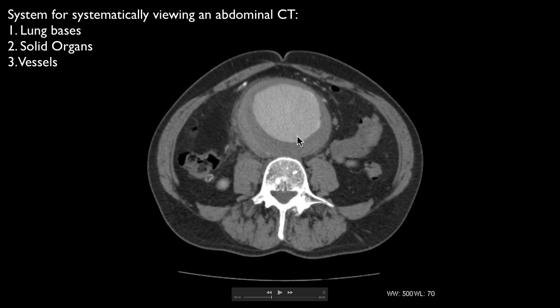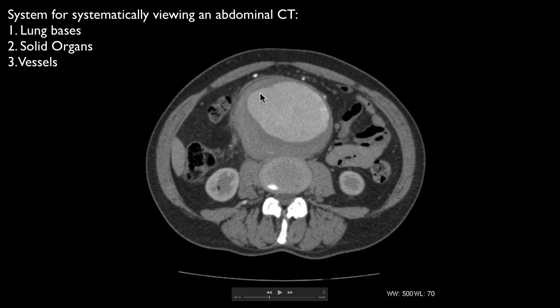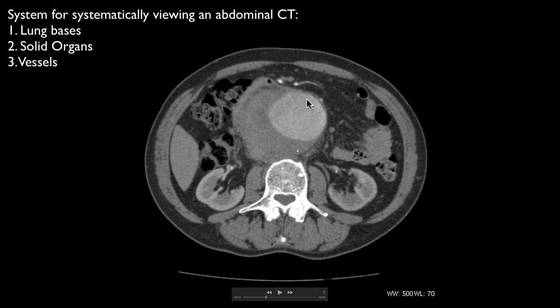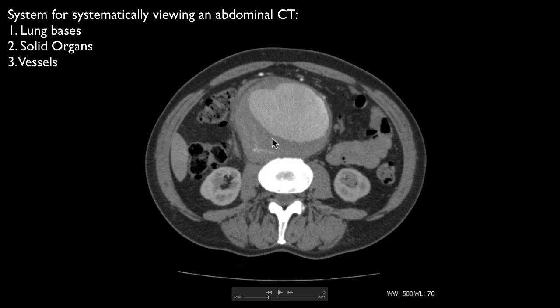Quite often, well, almost always within abdominal aortic aneurysms, you'll have areas of thrombus, and that in itself is a normal finding. This has got quite a big flow lumen. You can see all this contrast here, blood flowing through, but there is stuff outside the aorta as well. There are various other secondary signs of rupture.